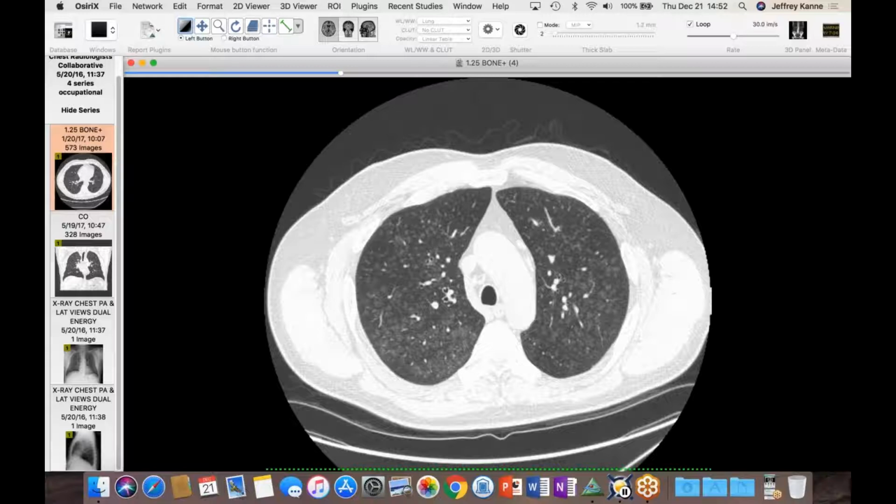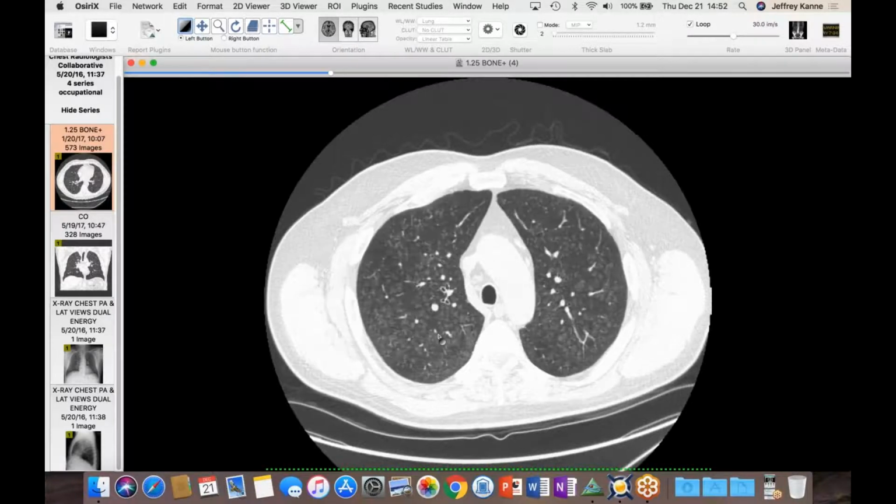So this is a presumed case of welder siderosis, which would explain the low number, the minimal symptoms he had. And it's probably related to his smoking. He was a smoker, but I think most people would agree this looks more like a typical siderosis case than RB. I mean, there could be some RB mixed in there, but I've just not seen these nodules this discrete and this large with RB.